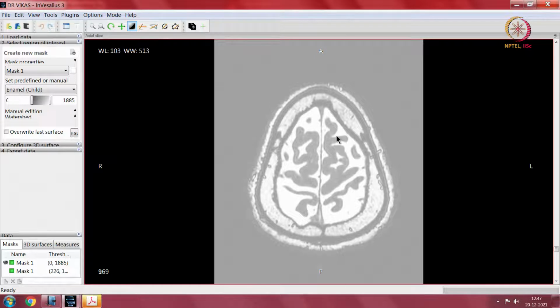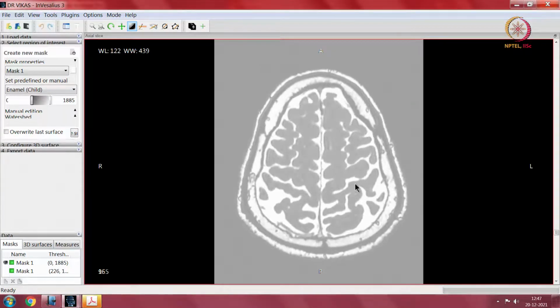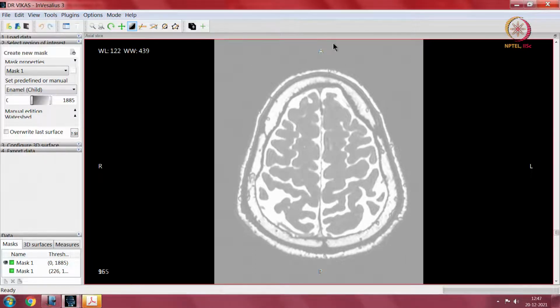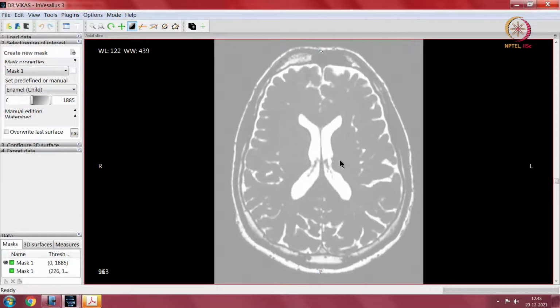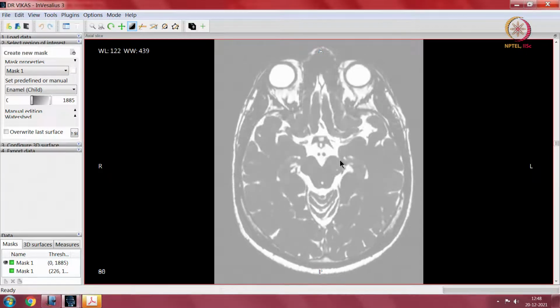So, for that reason we will start with notions which we had already solidified, concrete ideas, and we take up that. So, this is axial section. When I say axial section, there is left, right, anterior and posterior. How do we make out anterior and posterior? We scroll through that, confirm that the anterior part has eyes.